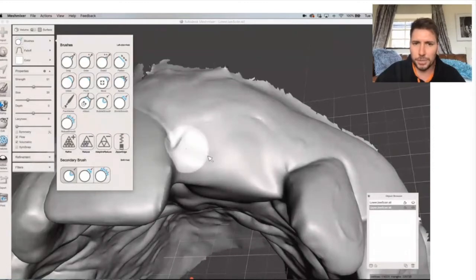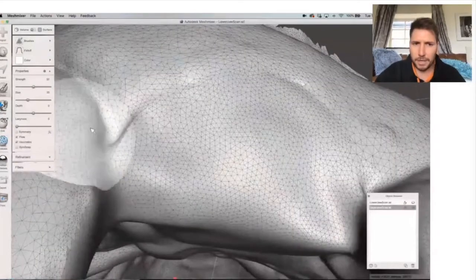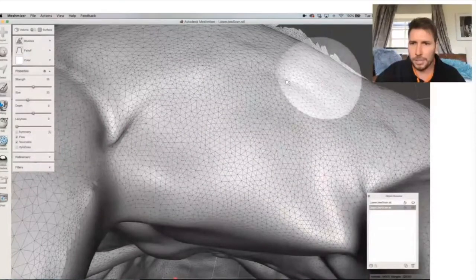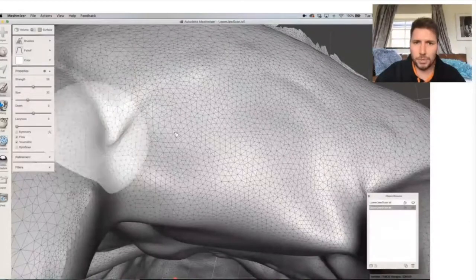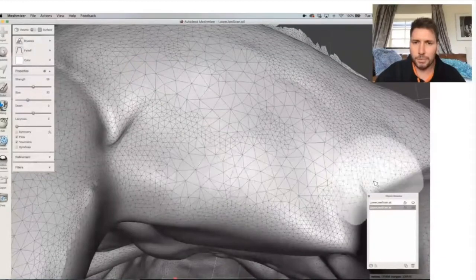No, it doesn't. Again, I'm going to bring this wireframe on to explain it so you can see. If I go on refine and I click here, can you see what it's doing? It's adding more triangle meshes. Now, if I go on to reduce, watch what it does. Look, it simplifies it. You see that? So it'll bring things in.